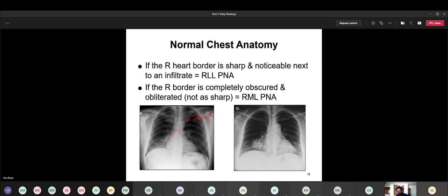Then we compare it to this here. I have to squint, but I could see what looks to be the right main bronchus, and then there's the left. And then we can still see the aortic knob or notch pretty clear on that one.